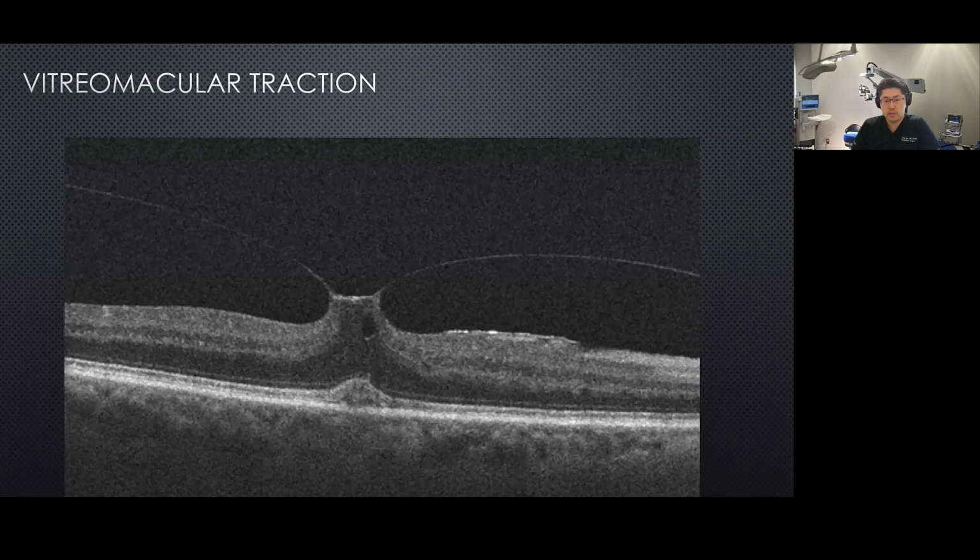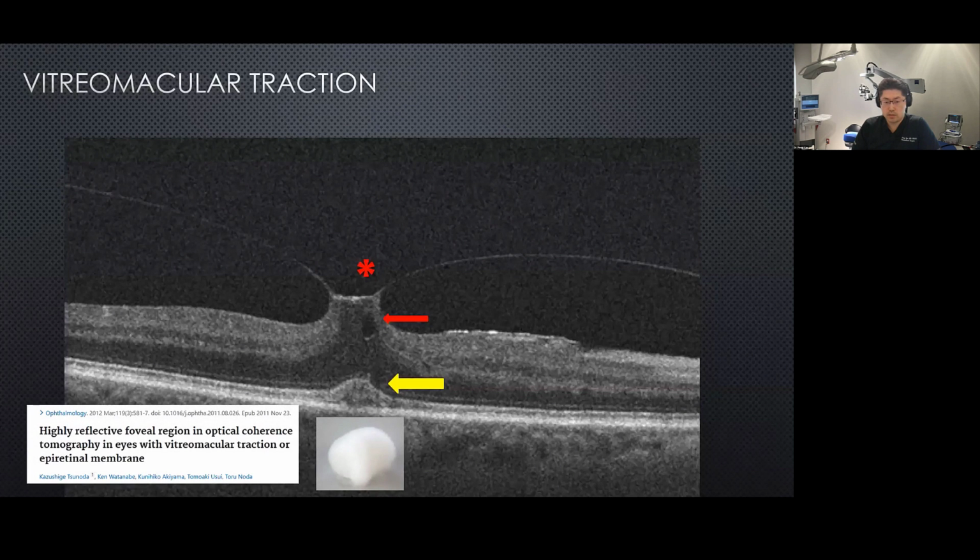So every time we present with OCT, we review these like a radiologist. We look at the vitreous cavity, which is optically empty, the presence of the hyaloid and vitreomacular traction, leading to blunted foveal depression, or in this case, a thickening of the foveal depression, the presence of intraretinal cystic cavity, and also disturbance of the outer retina involving the ellipsoid layer, which we'll talk about shortly. Now, you can see this red-yellow arrow pointing to an inward bending or bowing of the outer retina, secondary to an inward force pulling the retina vitreomacular complex inward. And this is a sign called the cotton ball sign, and usually is a good prognosis.